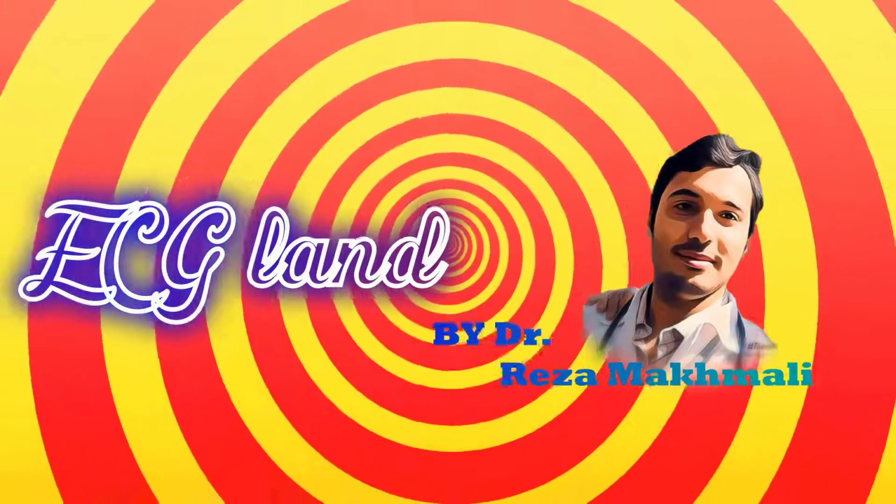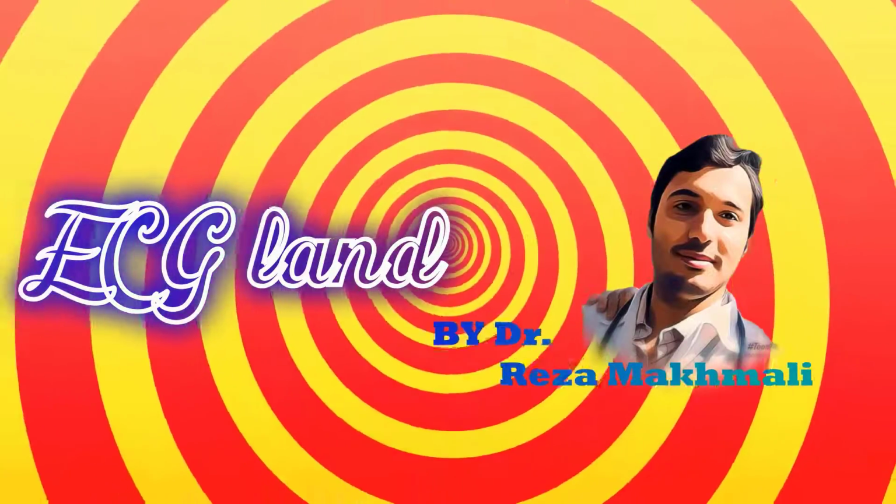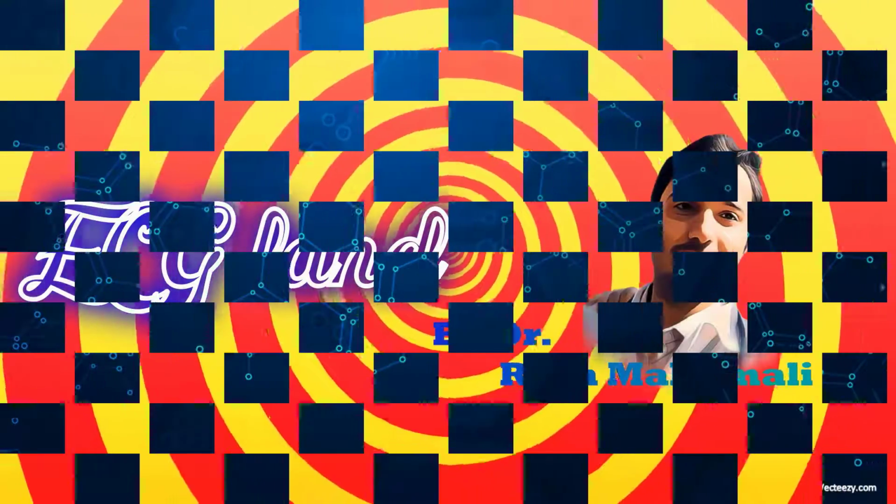Hi everyone. Welcome back. In this training video, we are going to talk about PR interval. Let's get down to the heart of the matter.